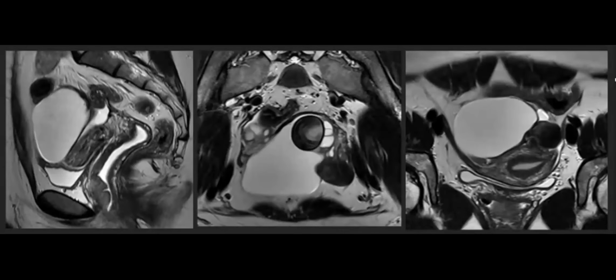So this is an example of another case of a cystadenofibroma, a companion case to Aarti's. This is from Mark Sugi's case collection. You can see here you have a cystic component and solid. So I guess this would be type 1 if we use that Korean journal classification. There are solid components to it, so it's not type 3. And there's the dark and then the cystic components here.